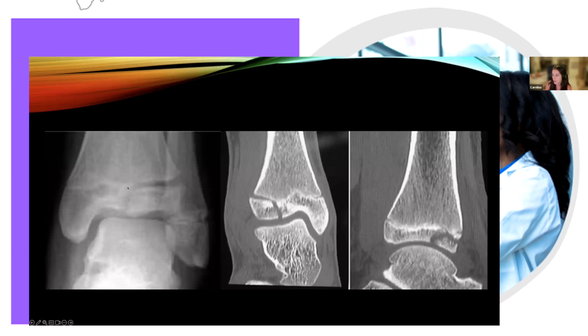You have a vertical fracture through the epiphysis and a fracture through that open aspect of the physis in the lateral aspect. You know it's lateral because the fibula is on the lateral aspect. You see that it's wide open. This is where the physis already started closing in this adolescent, and you have a fracture through that physis and vertically through the epiphysis. The triplane fracture would be a Tillaux also with a metaphyseal component, which makes it a Salter-Harris type 4.